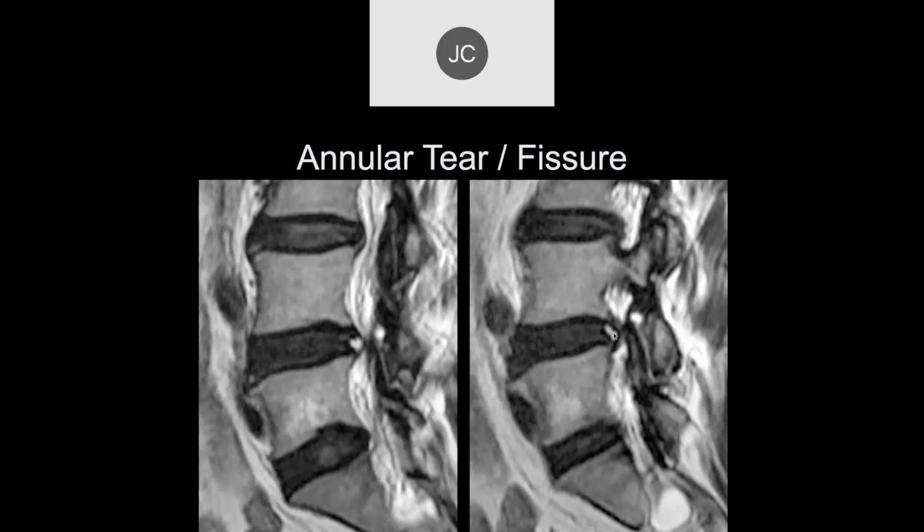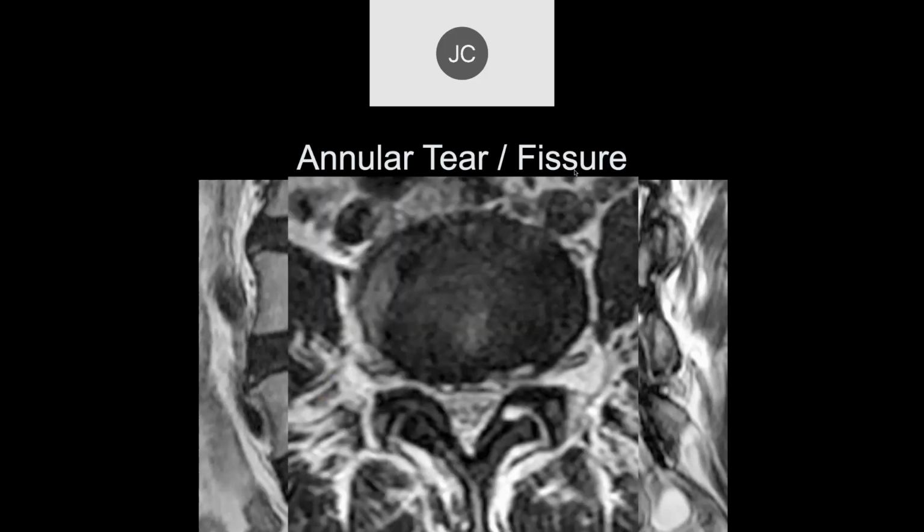And many papers have suggested not to use the term annular tear, even though histologically this can be associated with annular tears. But an annular tear, many people believe, is too suggestive that it might be a surgical lesion. And most people believe, as we'll talk about, that these are an indication of degenerative disease of the disc, and surgery is not proven to be helpful in treating degenerative disease of the discs. Other people call it an annular fissure instead of a tear, primarily just to connote that it's less likely to be a surgical lesion.